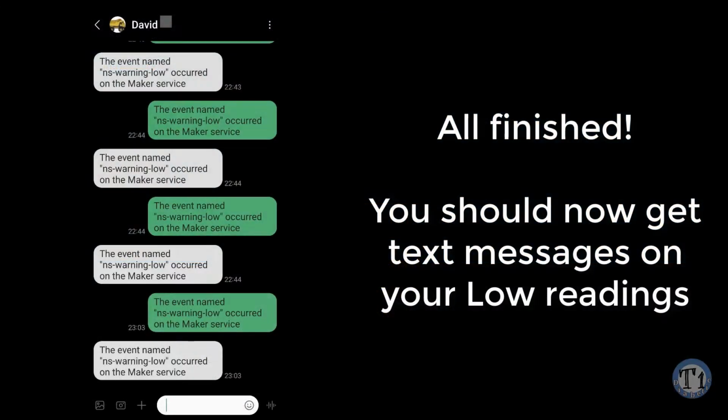All finished. You should now get text messages on your low readings.